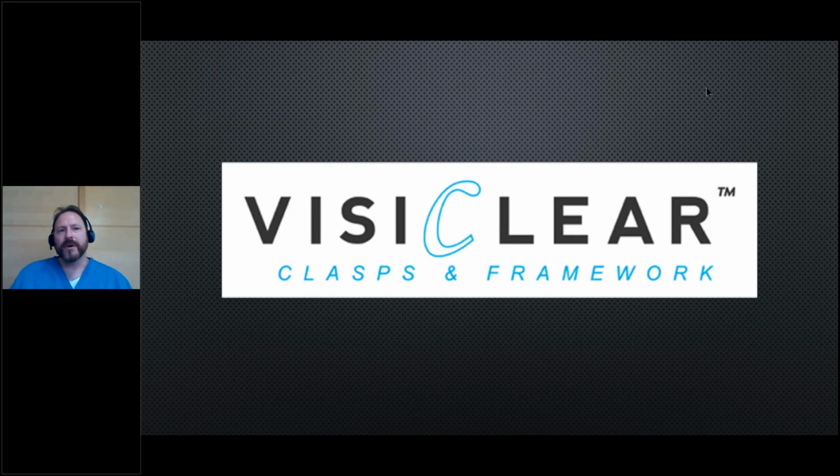We'll share with you kind of both sides of things. I'm going to show you how you can mill it. And for people watching that aren't digital yet, I'll also show you how you can inject this material, because there's not all the time that you're able to digitally design cases for whatever reason. And it's nice to be able to fall back to being able to hand wax it and inject it in those instances.